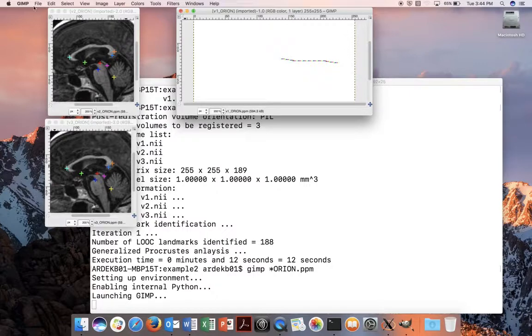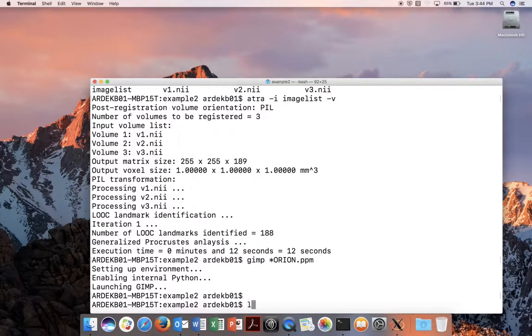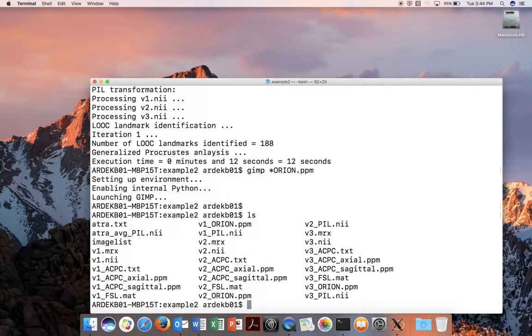Now I'm going to show you how this is done. For this purpose, you will need the AFNI program. The reason I like to use AFNI is that AFNI and ART define the XYZ coordinates similarly.